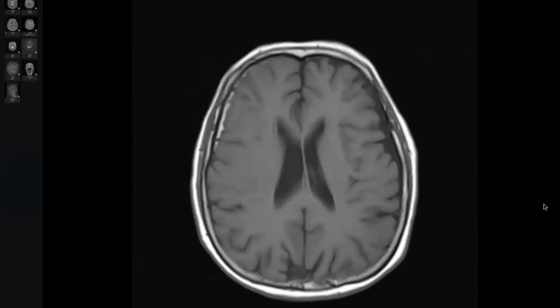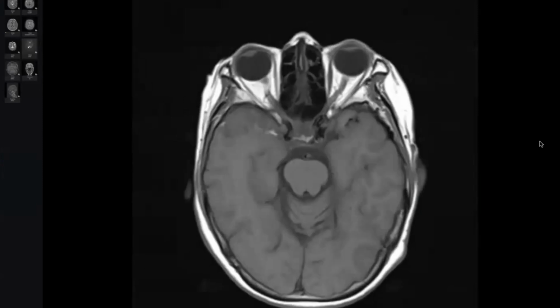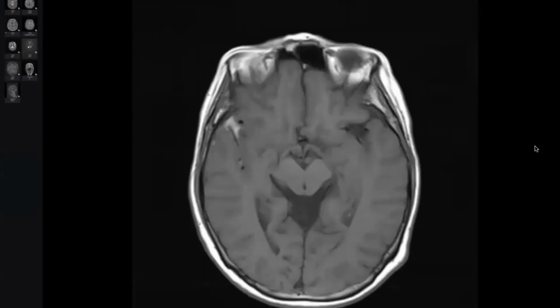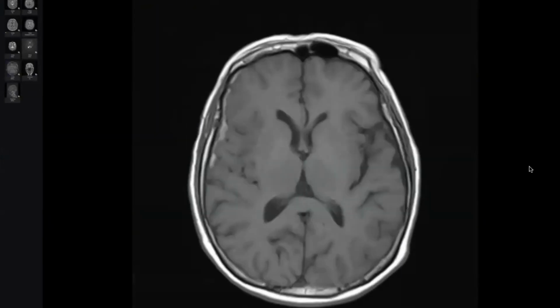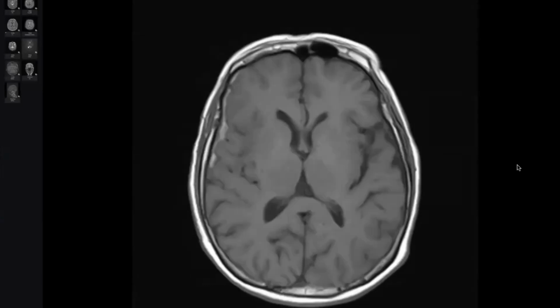Doctor, do you need susceptibility in this case to confirm? Frankly, I know T1 hyperintense are only few things: hemorrhage, proteinaceous material. By the way, you are right, this is your right to confirm in susceptibility. But I'm speaking in our daily practice. The patient has a recent headache and an aneurysm, and at the site of aneurysm, there is a very characteristic hemorrhage. What is the location of this hemorrhage?